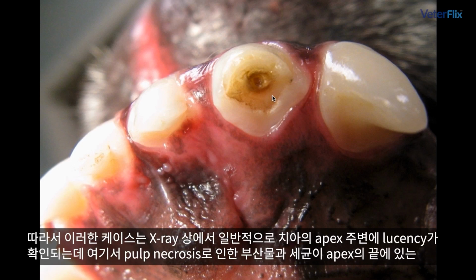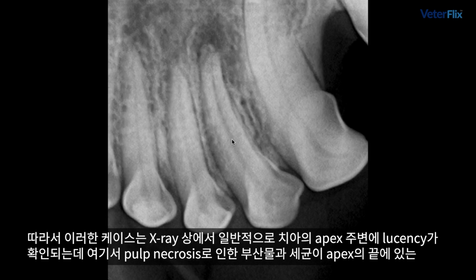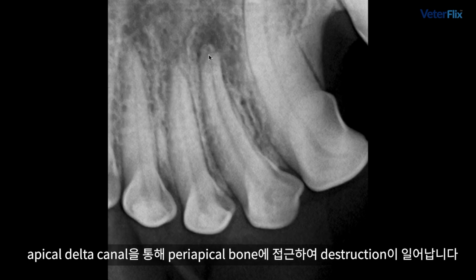So looking at this from a radiographic standpoint, many times what we'll find is that there will be a lucency that surrounds the apex of that tooth, where the byproducts of pulp necrosis and also in many cases bacteria are able to access this periapical bone by the little apical delta canals that are at the end of this apex and reach out into this hard tissue and destroy it over time.